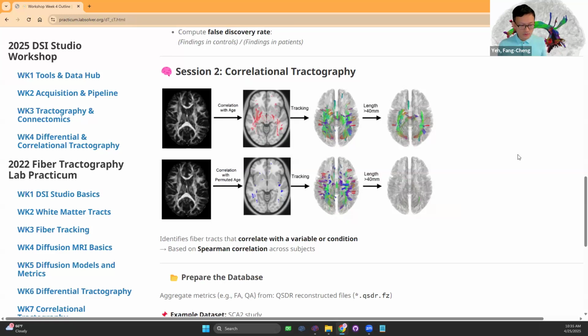So in group analysis, we may run regression, we may run group comparison. There will be statistics, there will be correlation with age or sex. Those statistics, we could use as a termination criterion. So similarly, just by changing or adding an additional termination criterion, we could do tractography for the entire group.